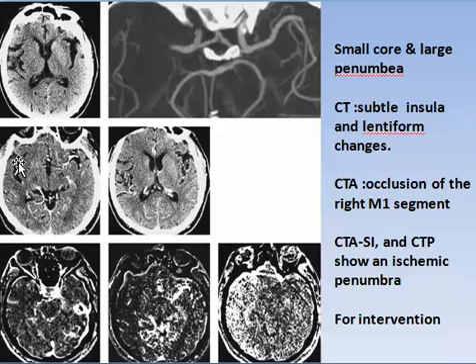So in the source image, definitely there is a definite change in density here, slow. So not only the frontal and temporal, but also the region of the posterior parietal. Here also, and here is definite down here, involving the whole distribution of the middle cerebral.